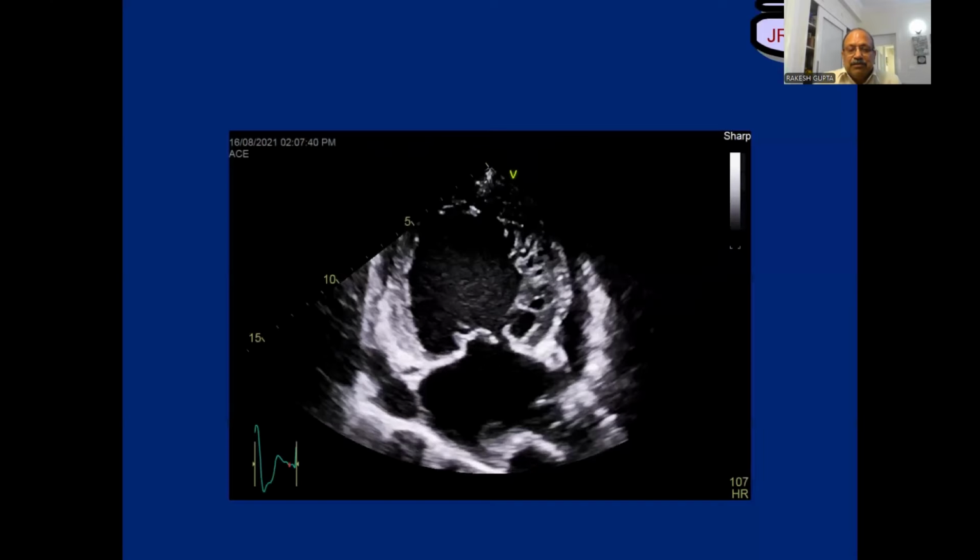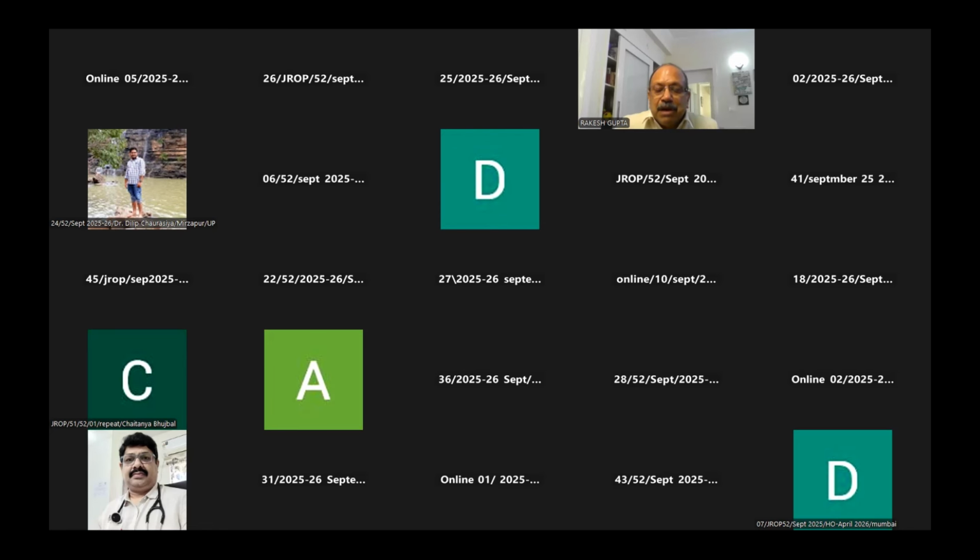And the first example which I showed you, that was ischemic cardiomyopathy, when you could see multiple layers of different wall motion, some were akinetic, some were hypokinetic, some were normokinetic. That is ischemic cardiomyopathy. Roll number 5, Dr. Debagna Adhikari.